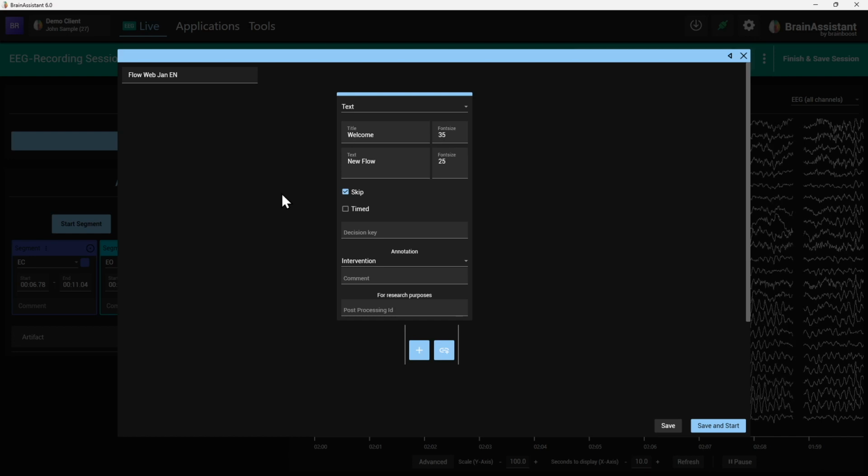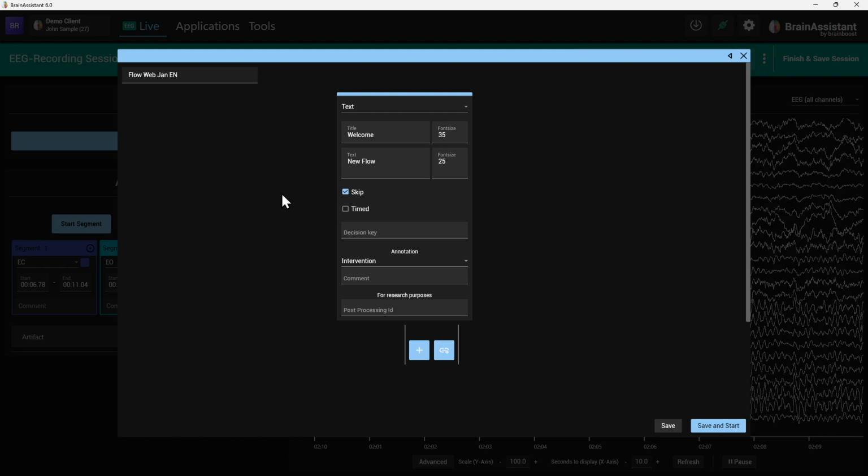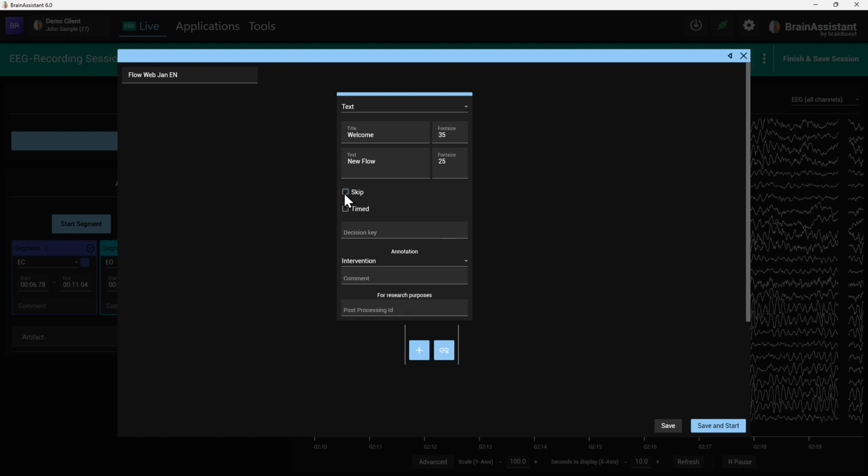So that the client can read a longer text, the client can ask questions, say, oh, something is itchy. So the client decides. Side note, I will show you, you can also always skip. So if there's nothing marked, you will have to press it as a therapist, as a trainer, but I would always at least choose one of those. So the show goes on. If you have to leave the room, they're not trapped.